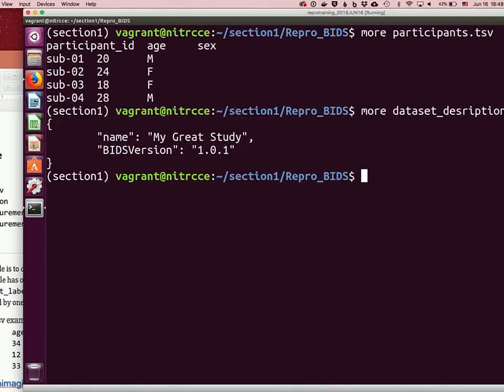So this means that we only use the first and fourth, because I've been doing tab, age, tab, sex. You're creating this file yourself. You want to do 9, you can do 9, you can do 4. There you go. But this validated in real world. Yeah, first, and we'll try this. We'll do the validator. I should actually see if this is valid.